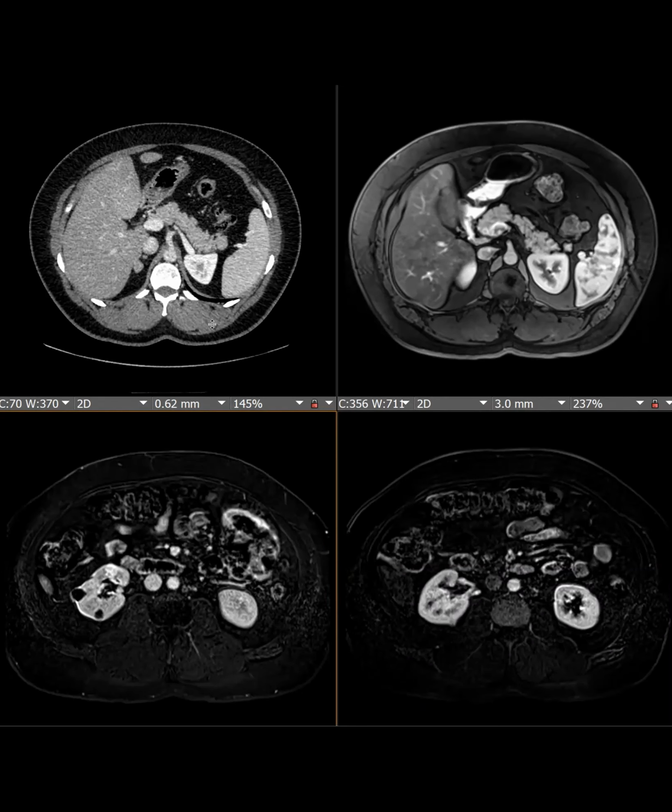Okay, wait, let's think about it. People speak up, chat in. You said the left adrenal is missing. I see like a nodule in the right adrenal also. Yes, there's one. They actually took this one out as well later on. And we know what it is because we have the pathology from that surgery. Okay, wait. And then there's renal masses. Renal masses. Pancreatic masses. Pancreatic masses, yes.